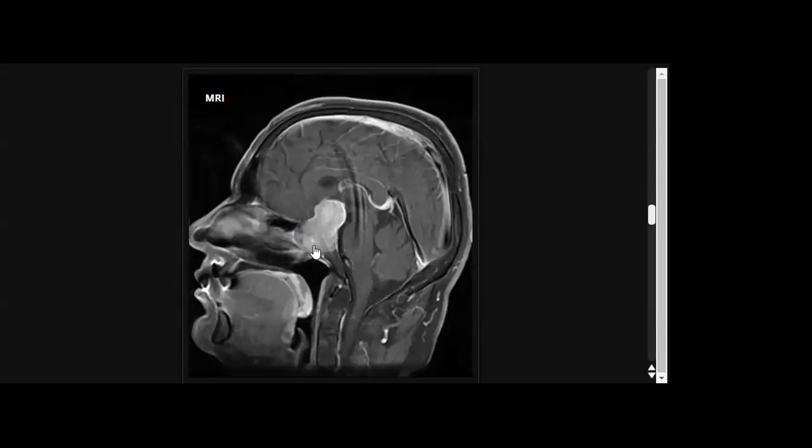Okay, this is an example of macroadenoma with the snowman sign, pituitary macroadenoma. Excellent, Yavuz. Yes, snowman appearance, classic here.